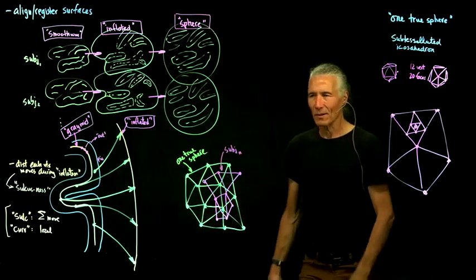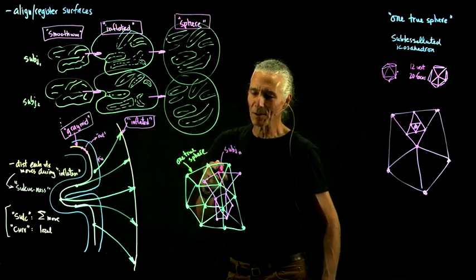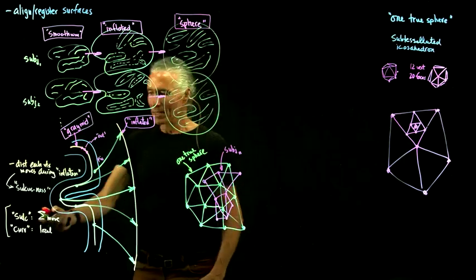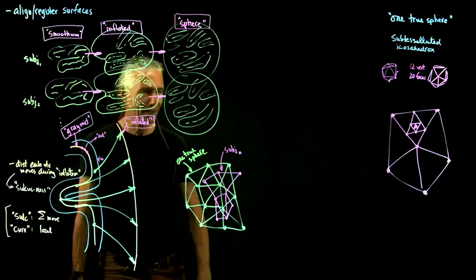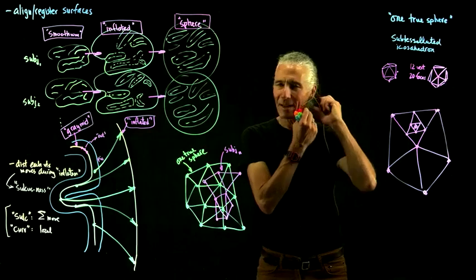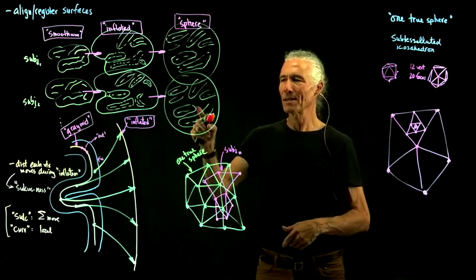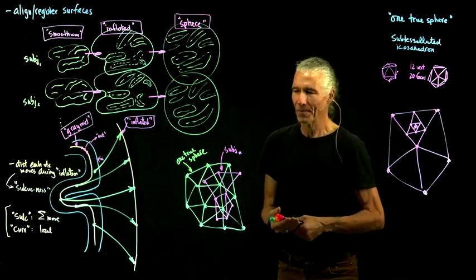That's still a sphere, so we turned subject N into a sphere, but now we're trying to align two spheres to each other, using this measure. And even though it's only one line of code, it gets you about 90% of the way there. There's all different kinds of little additional tricky things you can do, but this does most of the work, gets most of the sulci lined up, and it does a much better job than trying to do it in 3D.